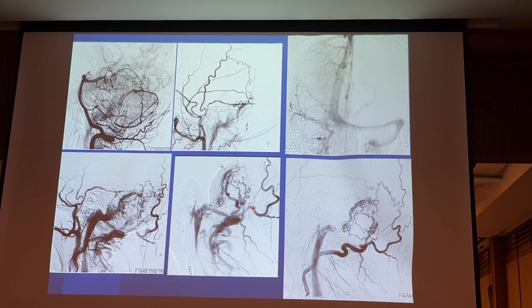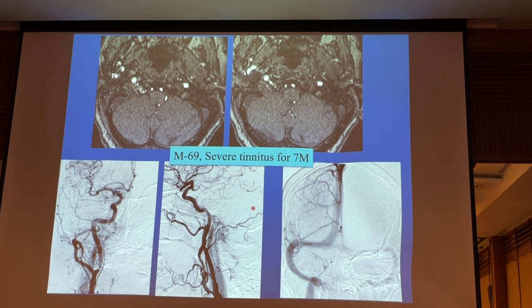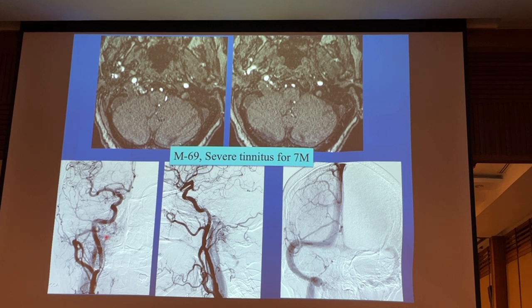Okay? So you do have to analyze the angiogram very carefully, not only when you go transarterial, but the same with the transvenous approaches. Other locations which are indicated for a venous approach are osteodural lesions, especially skull base osteodural lesions. You can see this shunt occurs at this condyloid vein.